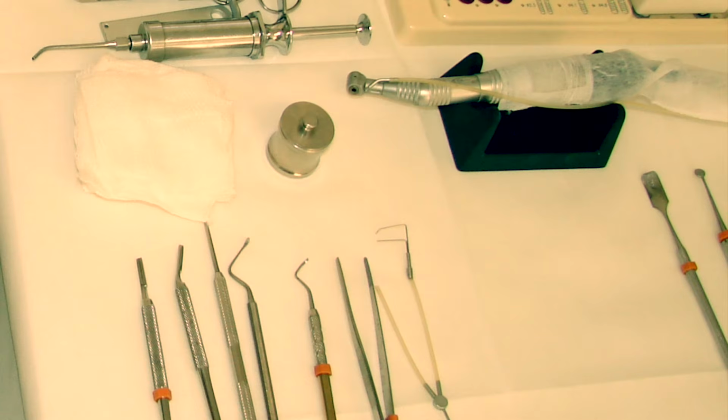Then we have the gauzes. You are always going to use some gauzes. And then on the bottom, from left to right, you have the straight and angled scalpel to be used with the blades, and then periosteum elevators, like the Molt, for example. Then you have the Lucas curette, then a sharper curette that is there, and then the tweezers, right? On the other side of the screen, you also have periosteum elevators, and the last one is the tip of the Molt one.